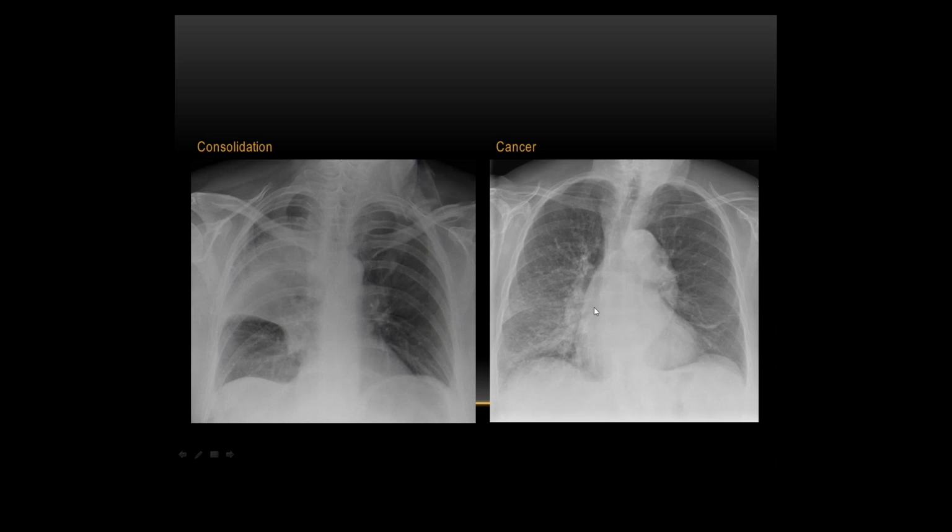So again, this is one where it's really good to follow up. This one here, they came with a more inflammatory clinical history, so we said, right, just do a chest x-ray. The follow-up chest x-ray came out completely clear. Now this is a good one here, because can you see the bronchograms? Can you see these lines coming through here? I don't know how well it projects on screen, but there are some bronchograms in there.